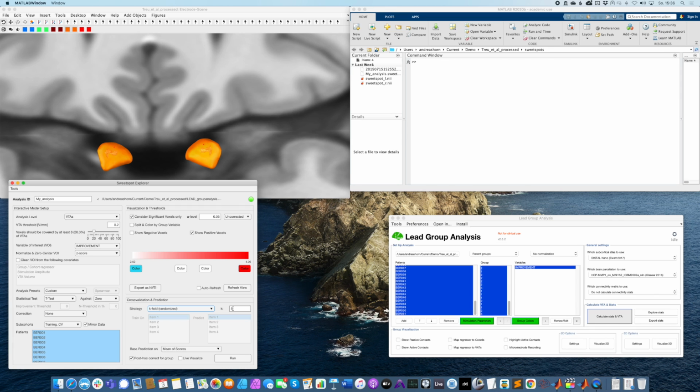It's always the same random sets, and then the first set will be left out, then the model is calculated, and then the members, or the entries of this first set, will be predicted. And that way, iteratively, we will get a prediction for each single patient, and we can now compare this prediction with the actual values, right?